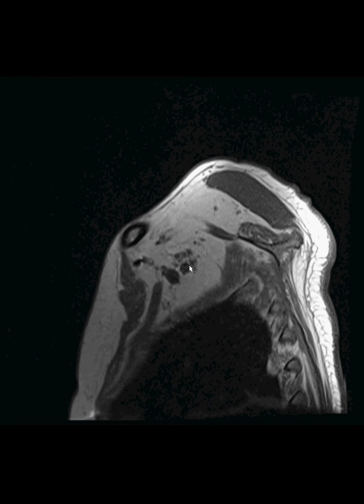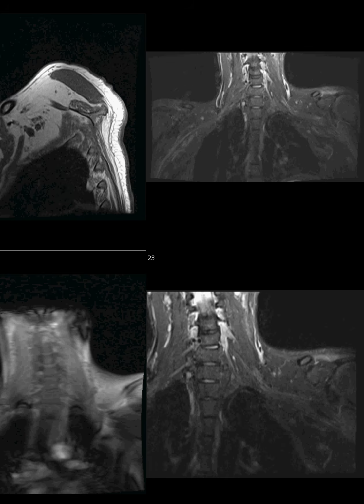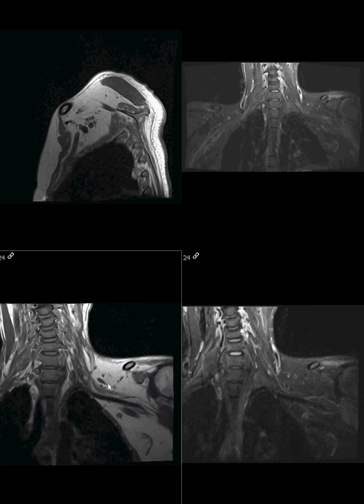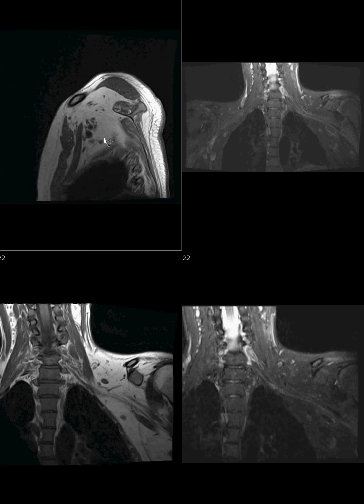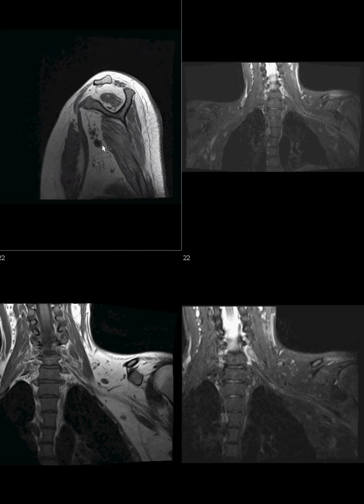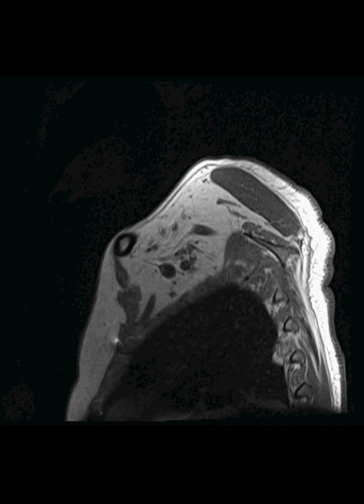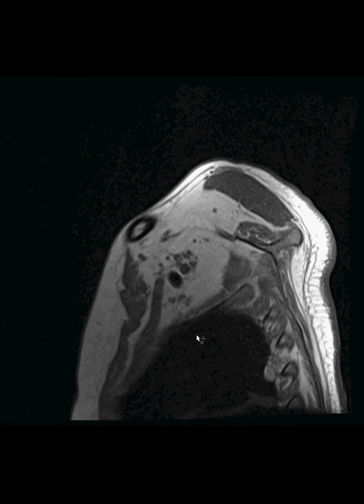And one of the things that I would point out in terms of anterior to posterior coverage is if you look at where this is located, they kind of follow this plane. It's pretty much in a pretty narrow coronal plane. I guess it's not going to make my cut lines, but basically sometimes we see people getting coronal images that go from skin surface to skin surface, and you can see it's a little bit of a waste because really what we're looking for is in a pretty narrow zone. If it helps to get higher resolution coronal images to narrow the anterior to posterior coverage of the coronal images, then one should do that.